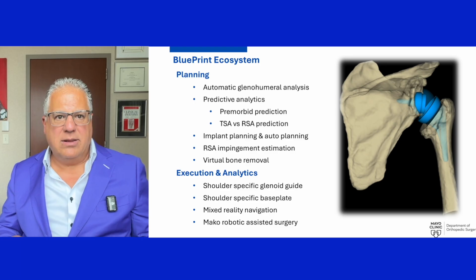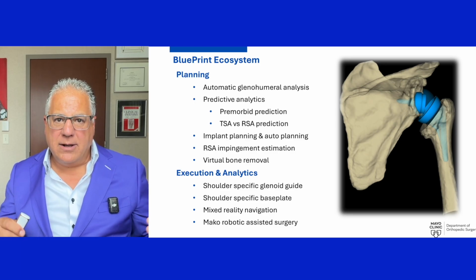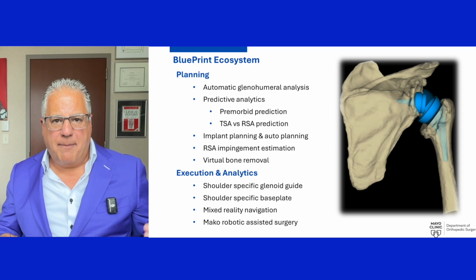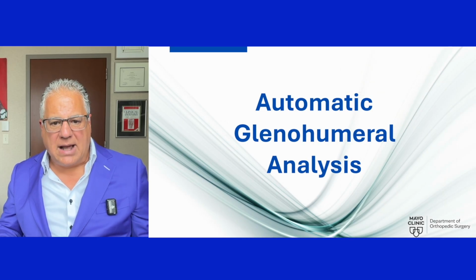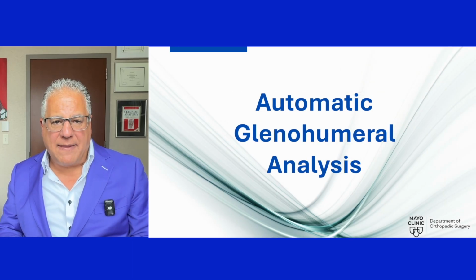But today, these packages also provide execution solutions, including PSI guides, patient-specific base plates, navigation, and of course, Mako robotic surgery. Let's talk a little bit about automatic glenohumeral analysis.